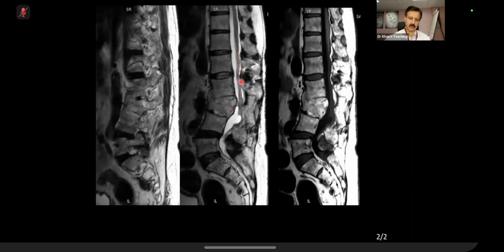And look at this, you have to develop your eyes because this is a very important exam case, and I'll show you multiple examples of this, where clumping of the nerve roots or thickening of the nerve roots on a T2 weighted sagittal will appear like this, and the examiner is going to open the case on a T2 sagittal. Once you pick it up, then you ask for axials. Here what is happening, that slice was going through at this level actually.